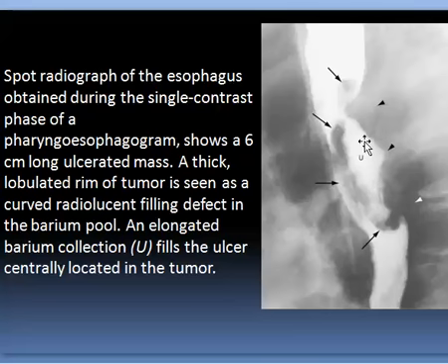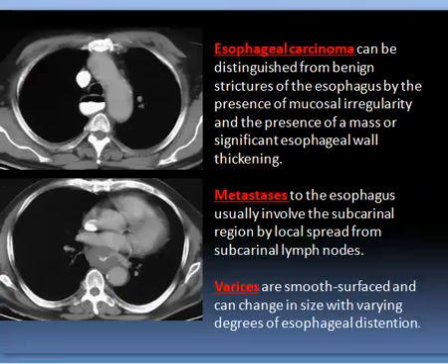This one is an ulcer along the everted edges, this edge and that edge, and this is the contour of the mass, which appears as irregular polypoid mass within the lumen, and there is mild dilatation above, and definitely there is pooling or pouch containing barium, which is the ulcer.